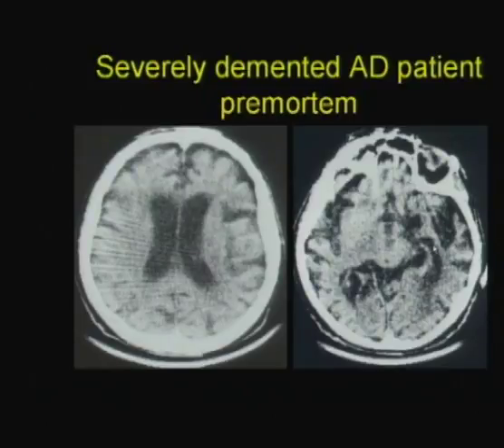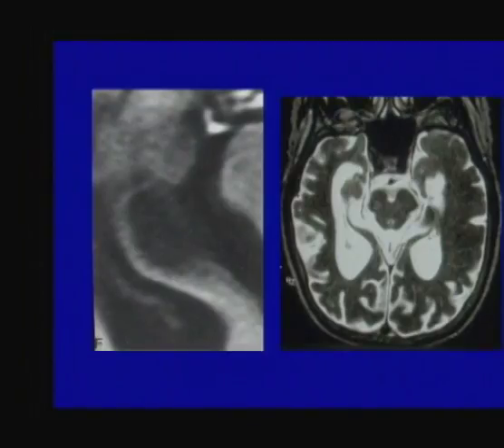And this is really what is pretty much the consensus today of how Alzheimer's disease progresses. It starts in the temporal lobe, it starts in the hippocampus, and then progresses on to the parietal lobe, and after that becomes a generalized atrophy. So what we see are the structural consequences of the pathology. So if you have an advanced Alzheimer patient, this is what you're going to see.